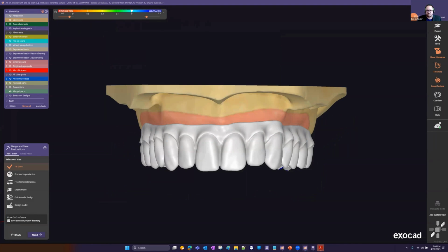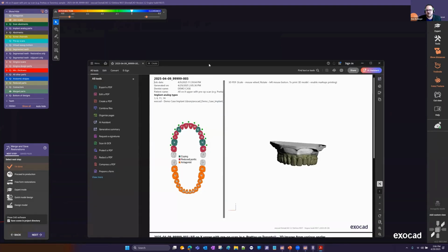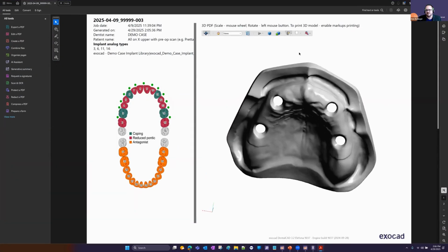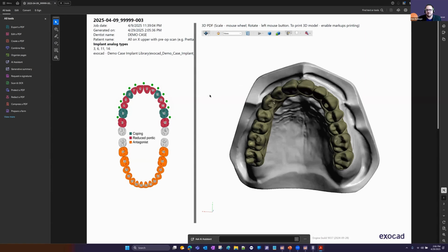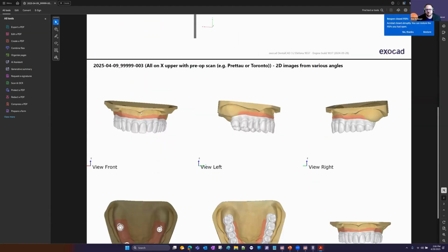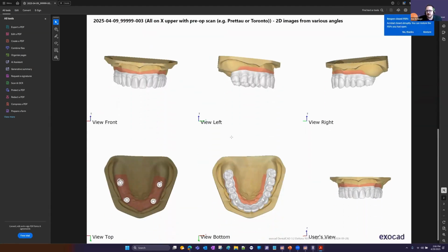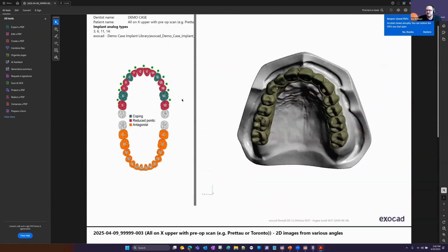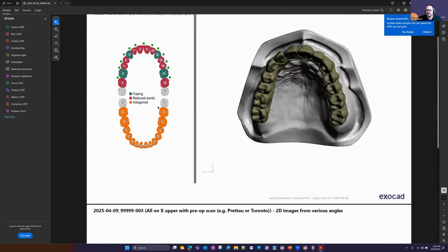But just an example of the PDFs, you don't have to enable 3D preview on the PDFs, but it is available as well, and you'd need to use Adobe typically for that functionality. That's what we recommend. But it's kind of cool that you get 3D preview and the 2D all in one document.